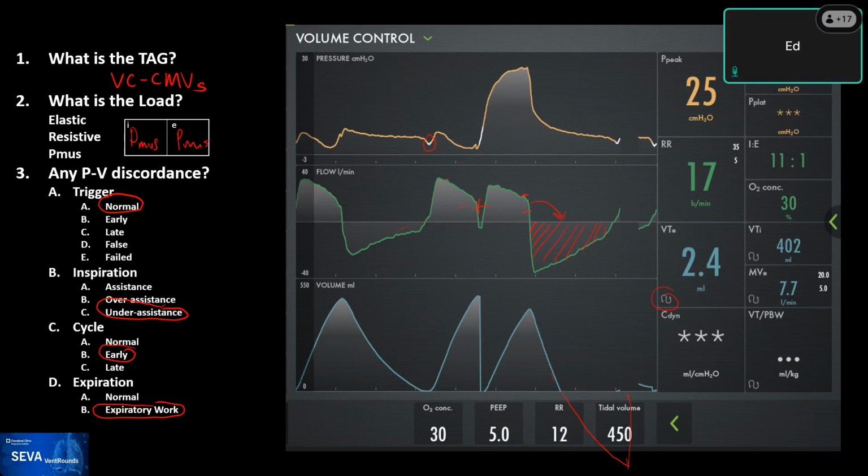Excellent. And there's no alarm apparently, so that's not a good thing. Yeah, it won't. Even though this seems like a pattern that could be identified, it's not identified.